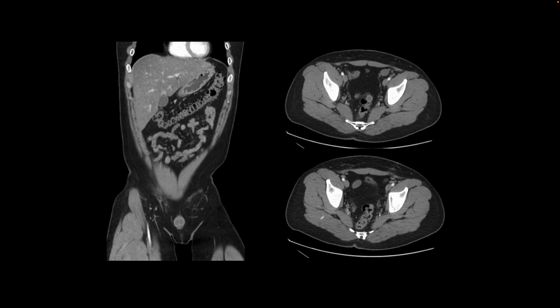Here is our next patient, and the reason for the scan was undescended testis. I'm showing you this coronal image a little bit more anteriorly to show you the inguinal canals on both sides and how they are empty, and we don't see any vessels going down into the scrotum that supply the testis. So the testes are absent in the scrotum, and on the cross-sectional images more superiorly, we find that this is where the left testis is lying in the intra-abdominal location, and this is the right testis at another level in the pelvis in the intra-abdominal location. So undescended testes are generally atrophic, and they are at risk for developing seminomas.